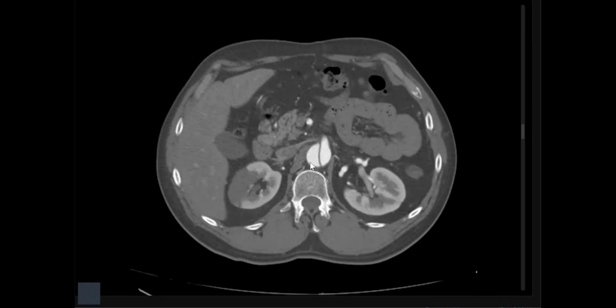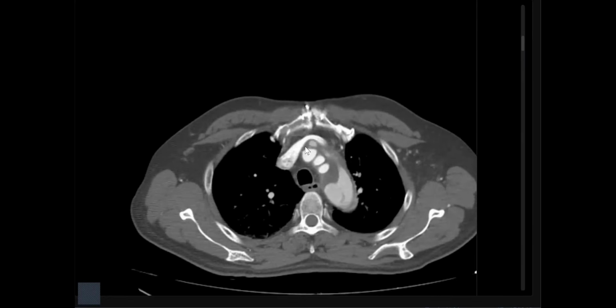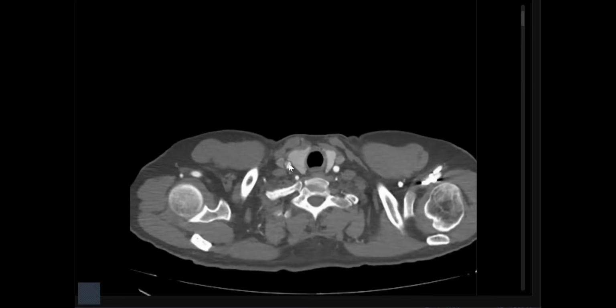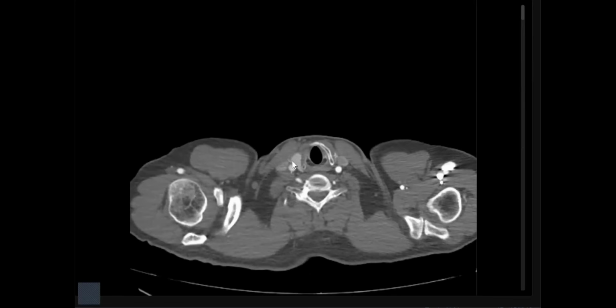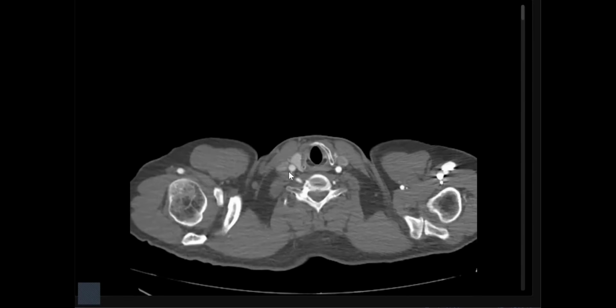It's very important to mention this point. Cranial extension: the flap extended into the brachiocephalic and into the carotid, so we may necessitate an extended study, CT for example, on the cerebral vessels, because I'm suspecting, but I think here it's ended.